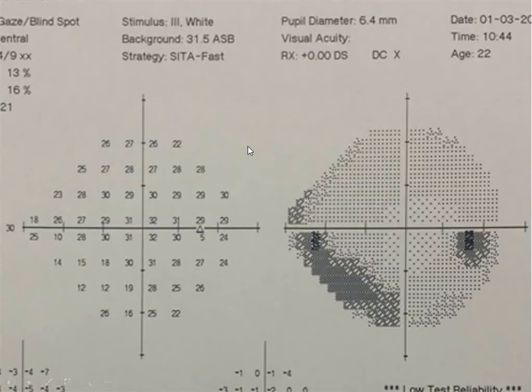So for example, look at this visual field here and ask yourself if it respects the principles of the hill of vision. And you'll see, for example, these points here that break the rule. So here we go from 25, it should get higher, but it goes to 10. And then it goes back up to 28, so we see an abnormality here. Here again, we see an abnormality. It was 25. As we move closer in, it should only get higher, but it doesn't. It drops down to 12. It goes to 18. This is still abnormal. Only here it gets up to 30. So we see abnormalities in this area, and that's kind of reflected in the grayscale here as well.